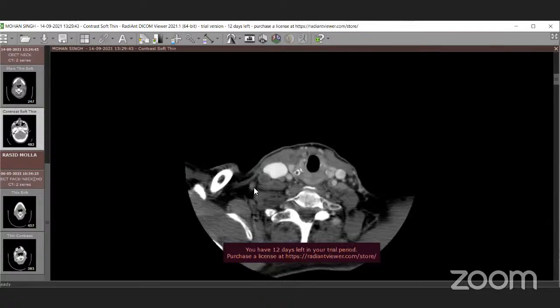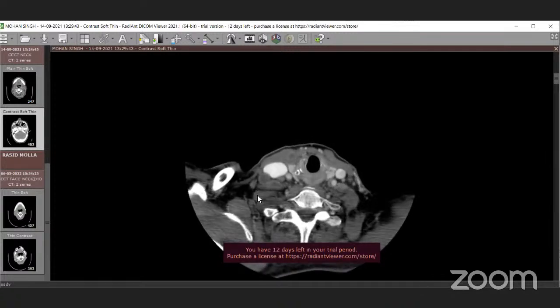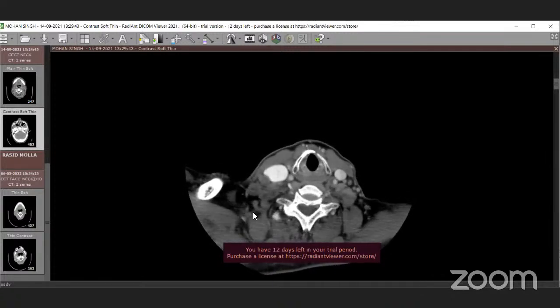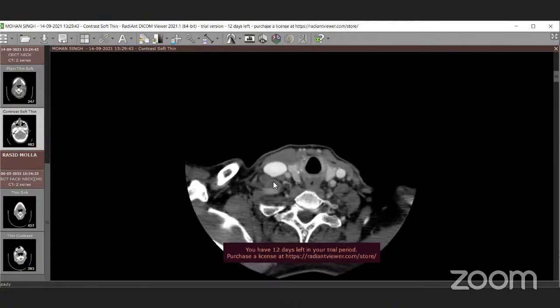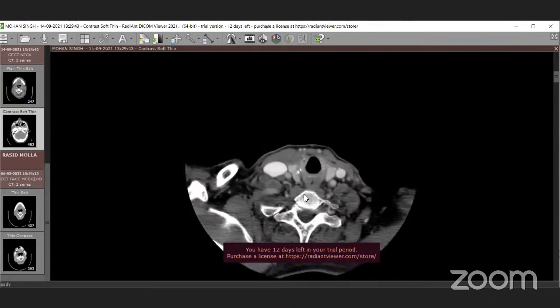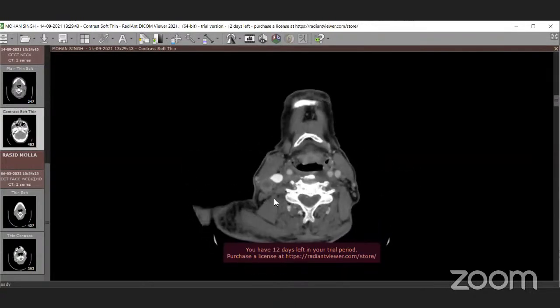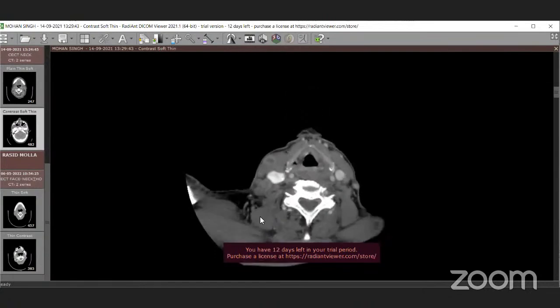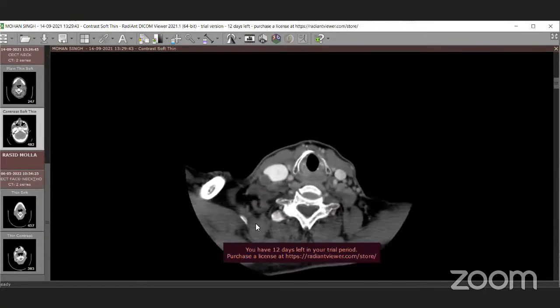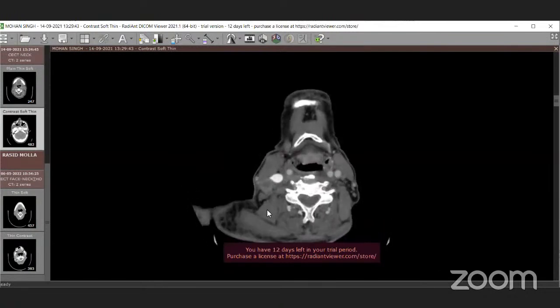That defines your caudal boundary, I think, from your literature. So the last thing, please show us the levator scapulae muscle, caudal boundary according to literature. Shonok, the last structure, please show us the levator scapulae muscle, and we will wrap up. This muscle is the levator scapulae, this triangular muscle that goes just anterior to the trapezius.